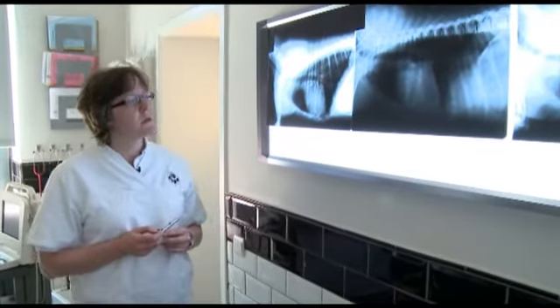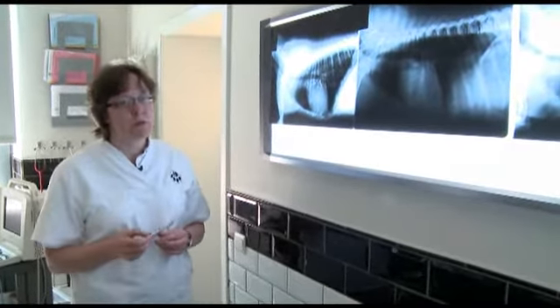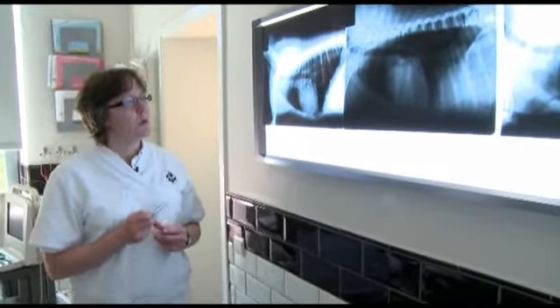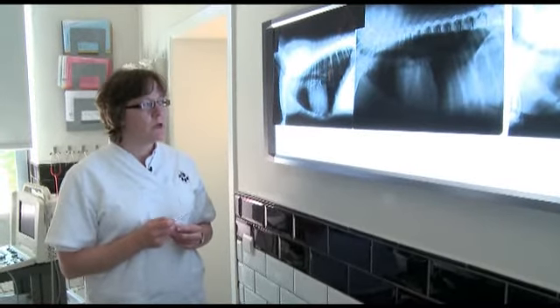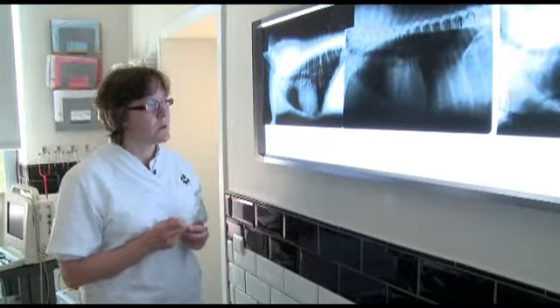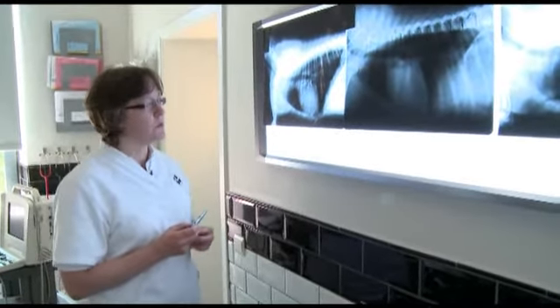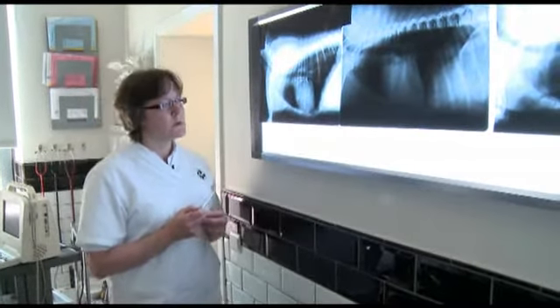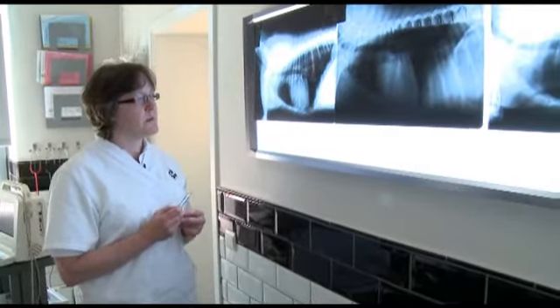After having assessed cardiac shadow, cardiac size, chamber enlargement, and major and minor vessels in the thoracic cavity, we will now concentrate on the pulmonary patterns. It will help us a lot in narrowing the differential diagnosis possible with many different cardiac and respiratory pathologies. A normal lung pattern consists of a vascular pattern where we can see the normal blood vessel structure.